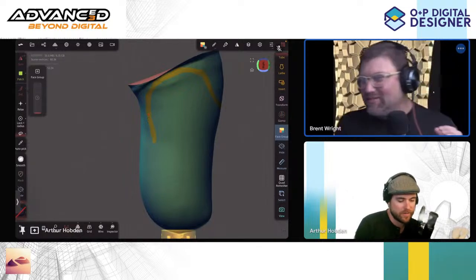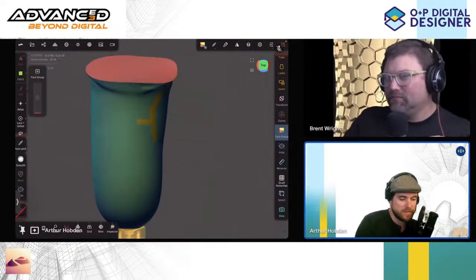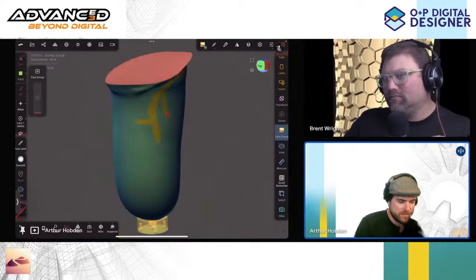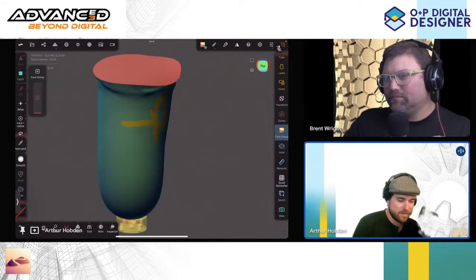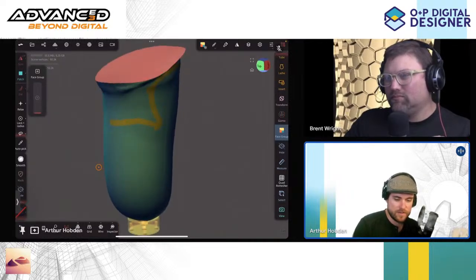All right, gotcha. So if I came in about this level, yeah, you should be good there. All right, so I'll go over here, and that's a little too far in. I'm assuming I should come out a little more. Yeah, something like that. I've seen enough sockets, but haven't clinically advised enough sockets. So something like that, nice and quick, nice and dirty, and all of this can be cleaned up at any point when we do the quad meshing.